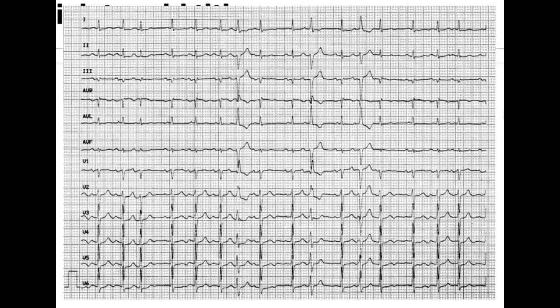Now, as mentioned before, there are certain things you have to know or you have to comment on when there's an extrasystole. First and foremost, they are of ventricular origin because, well, they look bizarre when you compare them to the other QRS complexes. And you must also comment on whether it's regular or irregular. And in this case, obviously, it's irregular, they don't seem to occur in any sort of pattern. And finally, whether it is monotopic or polytopic. So this is very well seen in lead 1 that 2 of the extrasystoles appear sort of similar, but the third one is completely different from the other 2. So yeah, in this case, it's a polytopic ventricular extrasystole.